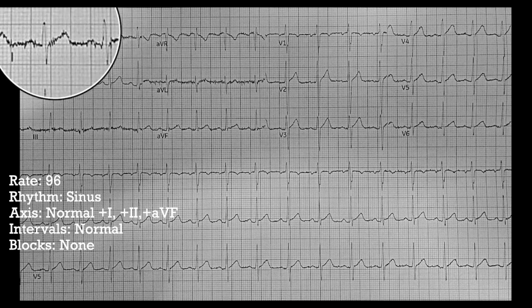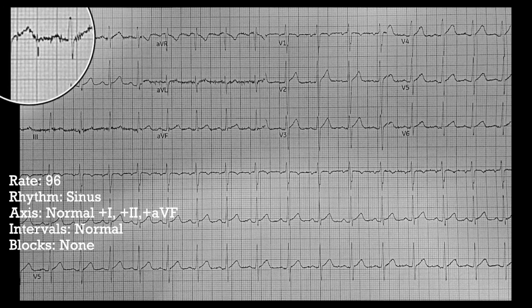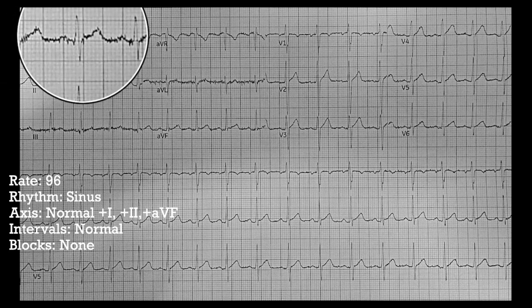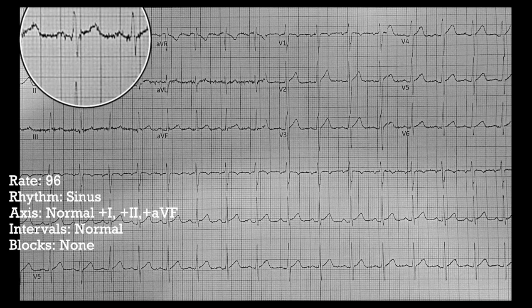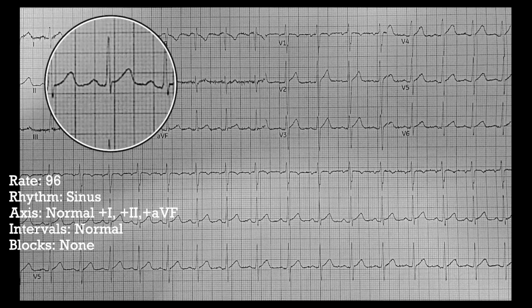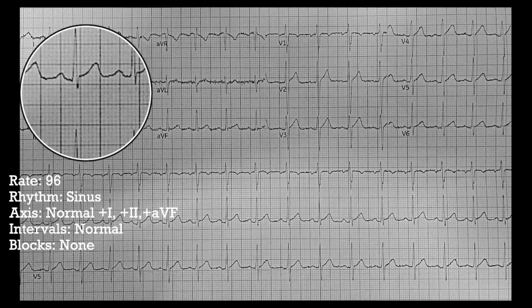Now, you might be fooled in some of these. You've got to find a decent looking complex, but I will say that there's not actually more than a box of significant ST elevation here. So no significant ST elevation, no significant ST elevation. And we'll talk about how to really differentiate that later.